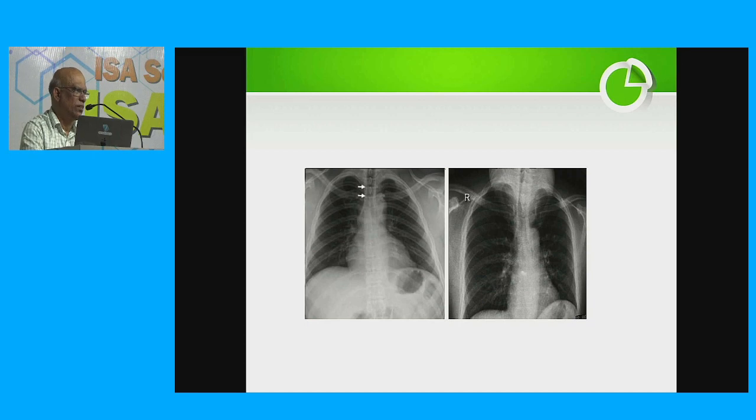Can it be a tumor? Goiter, thyroid. Thyroid goiter. Could be an enlarged thyroid, or any other mediastinal masses, or other cysts. Yeah. And if you have any doubt, you can go for a lateral view. This can be a spotter.